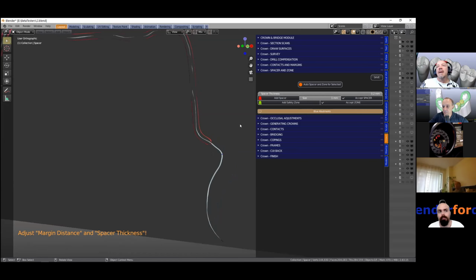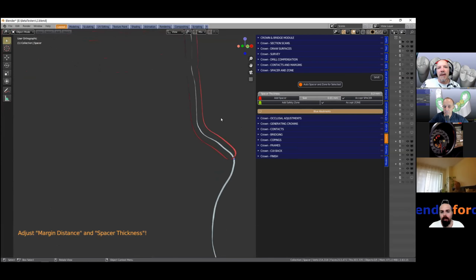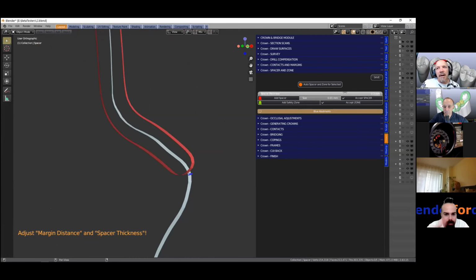Okay, so what I've got is we can set this gap up top here with the slider. So 0 point whatever. I don't know quite whether this is what you mean. We've got quite a good system of getting it close to the margin. So in cross section, you can see. Nice, okay.